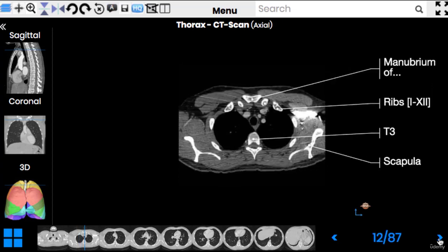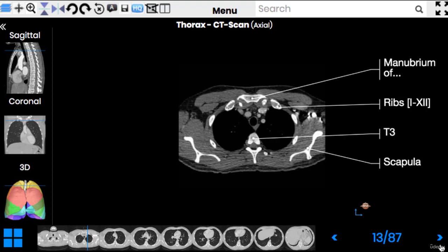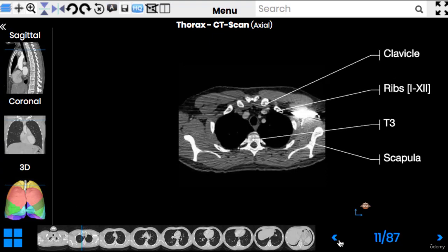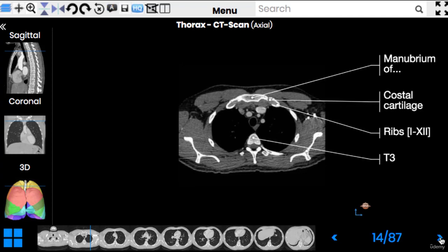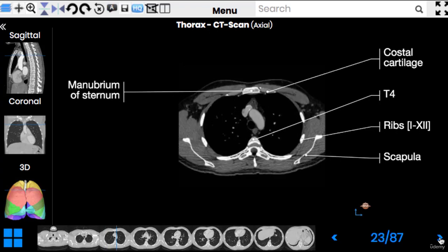Well, as I descend down, you can see another particular picture. Now we have two vessels, the left and right brachiocephalic veins on both sides. So our subclavian vein joined the internal jugular vein and created these two vessels. They are slightly different. You see on the left, I see the oval-shaped shadow. This is because our left brachiocephalic vein lies more horizontally than the right brachiocephalic vein, which takes an absolutely vertical course. And as I follow them, you see how they converge, creating the superior vena cava right here.